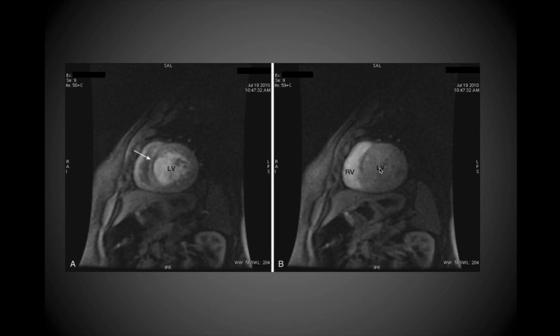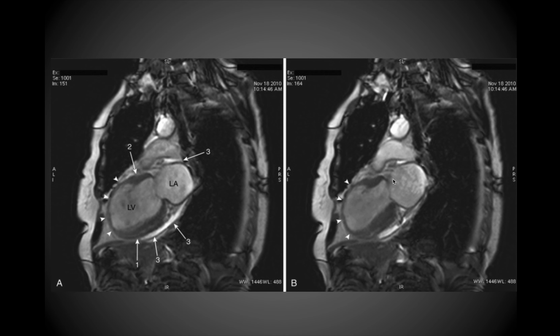And then over here, this is where the contrast has been allowed to cycle through the body. In the image on the left, this is an early image, so the contrast agent is still clearing the left ventricle. And then by this image over here, now it's filling back up into the right ventricle. And so that's why you get that hyperintensity in the right ventricle. And then you can, again, visualize the left ventricle as a darker structure just posterior to it in that other view.